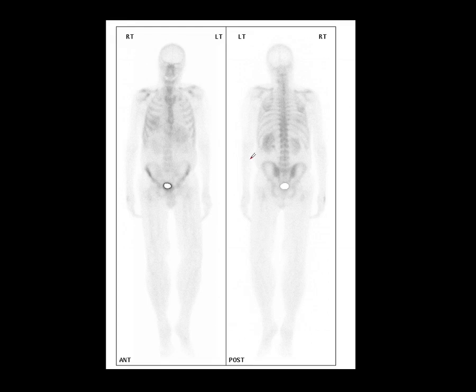So why is the tracer being taken up within metastases like this? Well, there are a number of reasons why that might happen. Increased blood flow, damage to the underlying cells, but I suppose the one that I like best and that I feel is most convincing is that any damaged, dead or dystrophic tissue will have dead cells, and that includes of course tumour sites where a large number of the cells will infarct due to poor blood supply.